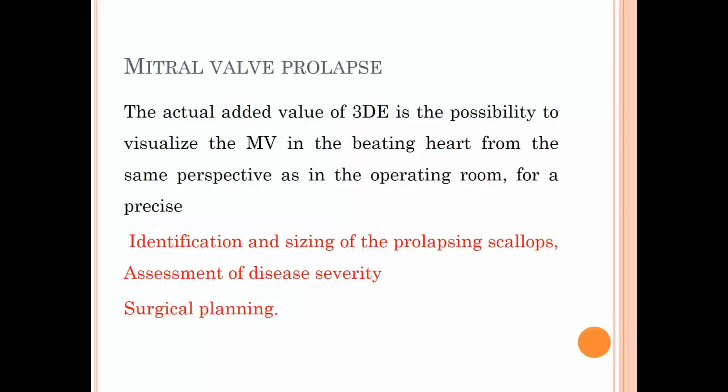In the cases of mitral valve prolapse, the added value of 3D echocardiography is the possibility to visualize the mitral valve in the beating heart from the same perspective as in the operating room for precise identification and sizing of the prolapsing scallops, assessment of disease severity, and accordingly the surgical plan.